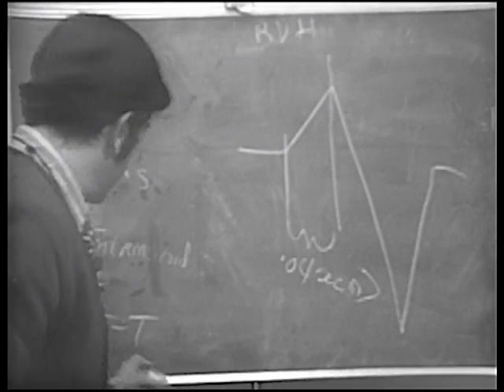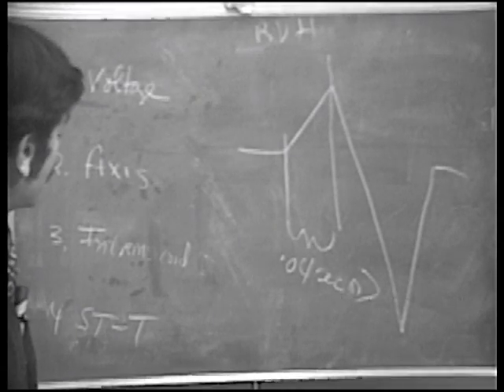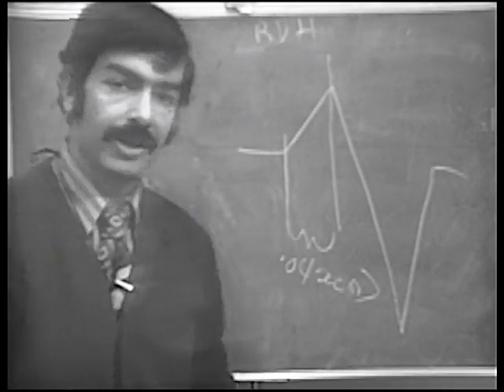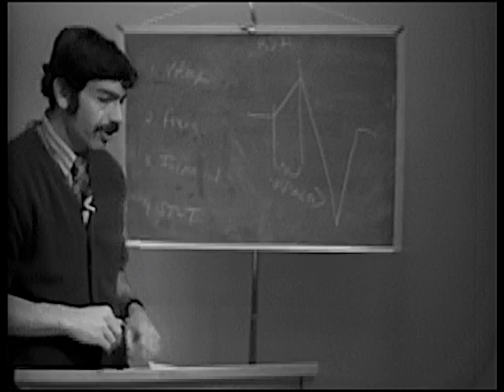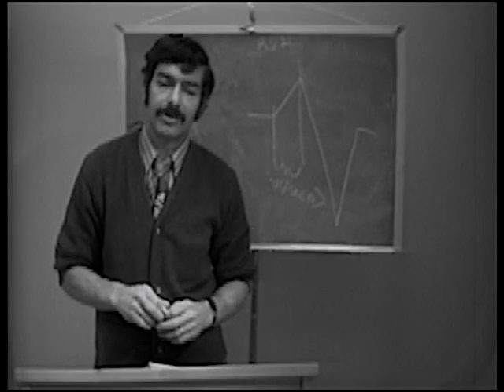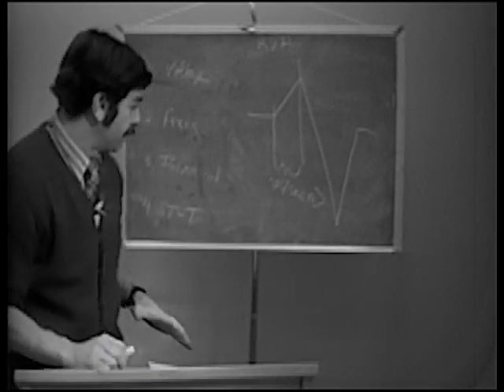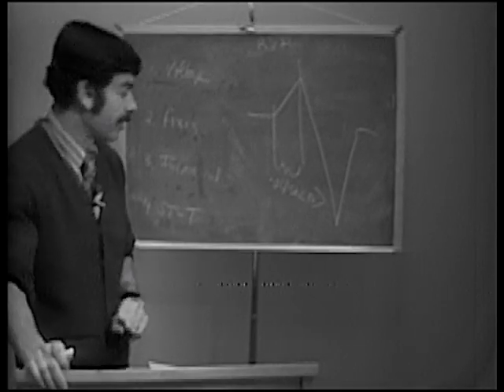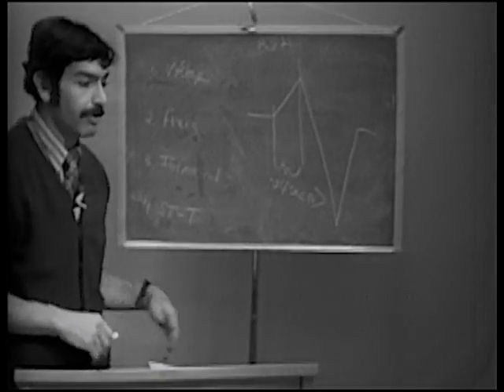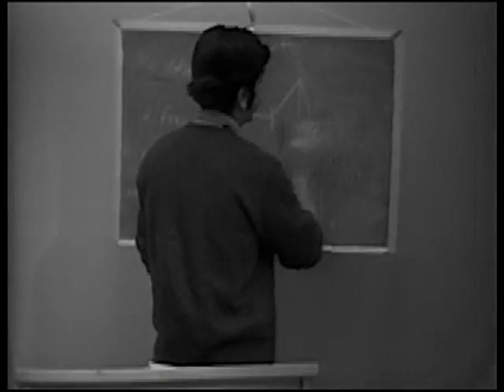Now the ST-T wave changes in right ventricular hypertrophy don't have the same prognostic significance that those do in left ventricular hypertrophy, but they generally are a pretty rough index of the load upon the right ventricle. If there's a pretty high pressure load in the right ventricle, you'll see ST-T wave abnormalities, whereas with milder changes, you might not see them. So it's a very rough index of severity.